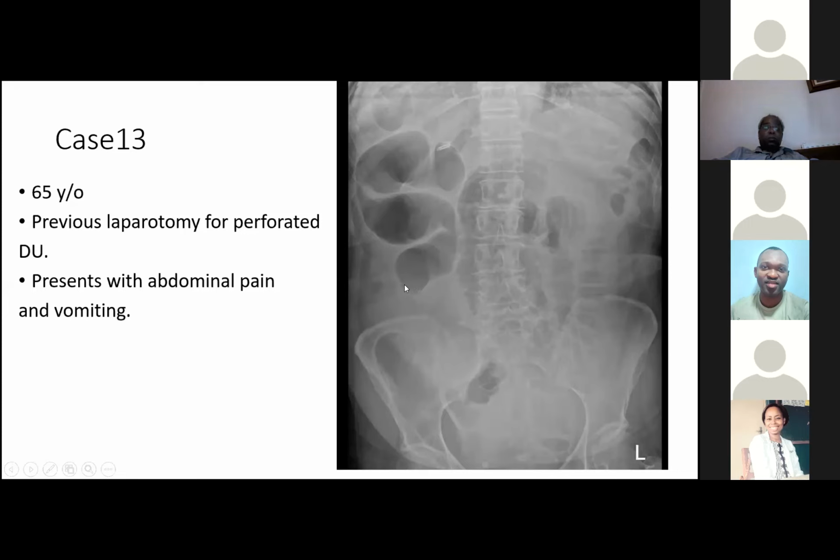And the large bowel, in terms of location: typically the cecum is over here where the arrow is, and it goes upwards, ascending colon, and hepatic flexure around about here. Then you get the transverse colon, which extends across here and goes upwards towards the splenic flexure. Then you get the descending colon, which continues as the sigmoid colon, and then finally the rectum. So by location and by the appearance of the markings, we can clearly tell that this is small bowel distension with normal caliber large bowel.